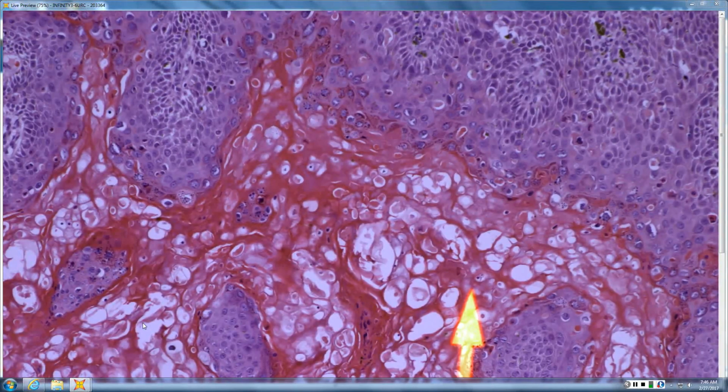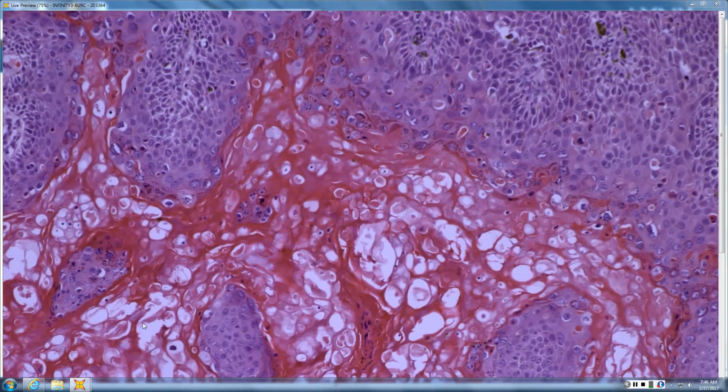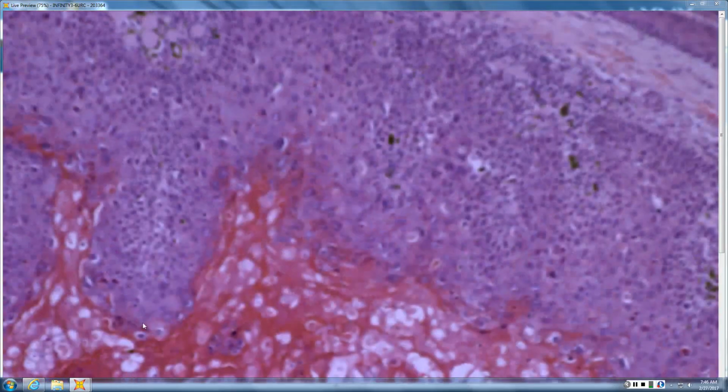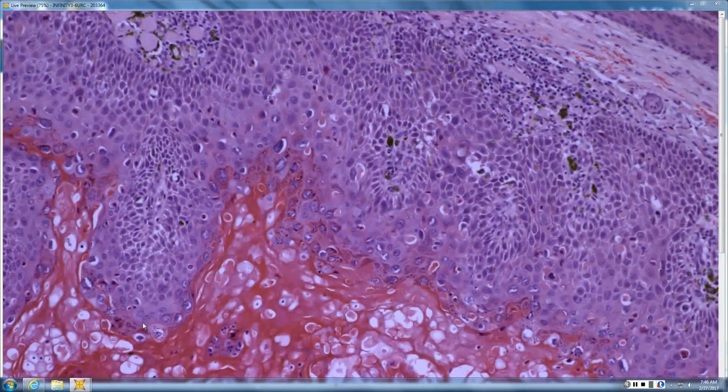Like a verrucous cyst. So verrucous cysts are papillomavirus-induced cysts. They start on acral sites in the acrosyringium and in other sites in a hair follicle, and become a cystic lesion. This one has koilocytic atypia and some atypical mitoses. When they have a high-risk type of HPV, they go on to become cystic squamous cell carcinoma. So many cystic squamous cell carcinomas arose as cystic papillomas or verrucous cysts.